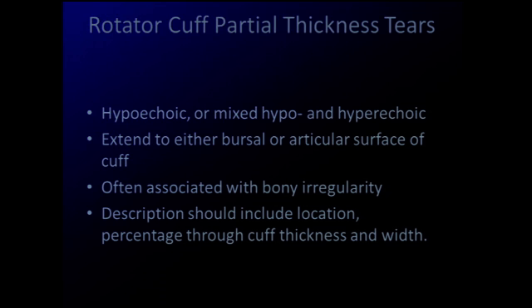Now with partial thickness tears, again, it may be hypoechoic or mixed if there's debris, or may even look hyperechoic depending on how you're imaging the patient.